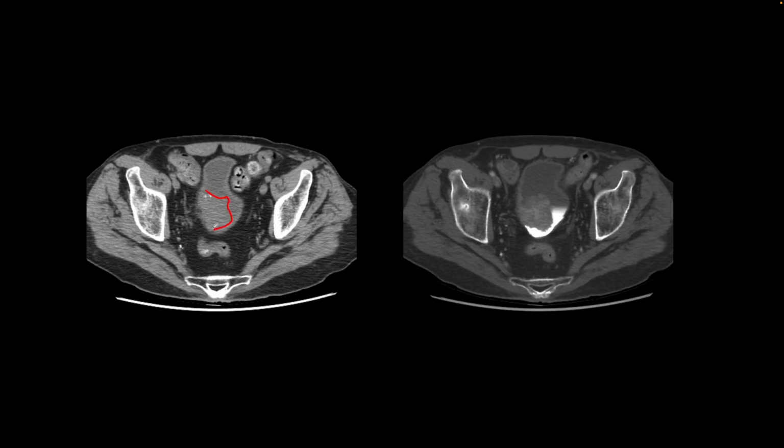On the non-contrast images, you may be able to see the superficial calcifications very well, which are present a lot of times. And then on the delayed images is when the mass is delineated by this excreted urine into the urinary bladder. And so that's the large mass arising from the right lateral wall of the urinary bladder growing into the lumen. Sometimes in advanced stages, we may be able to see the invasion of the urinary bladder wall and metastatic disease to the regional lymph nodes.